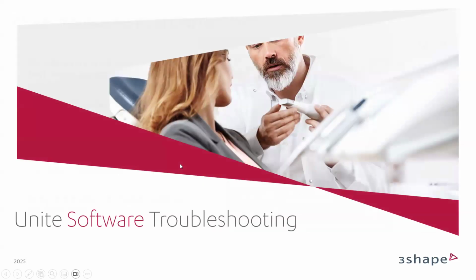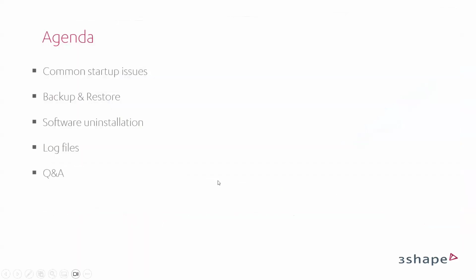And now we are just passing through the Unite software troubleshooting workflow on some main and basic problems that you may face when you are starting or running Unite. So let's just quickly check the agenda that we're having here. We will check some common startup issues.